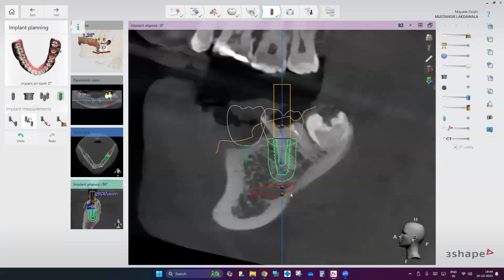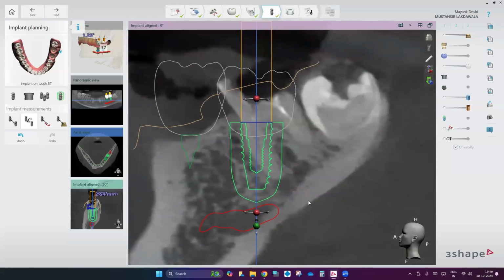And let's check the tangential view. In this case, if you notice, the primary stability is going to come because the implant is not going to actually enter the path of direction of the natural socket. Can you appreciate this?